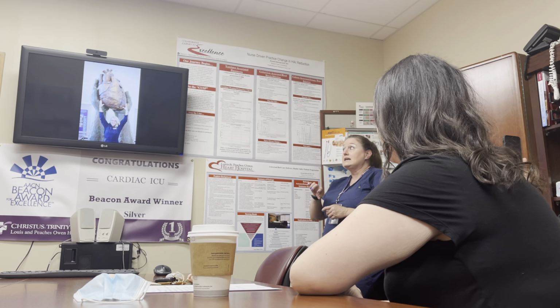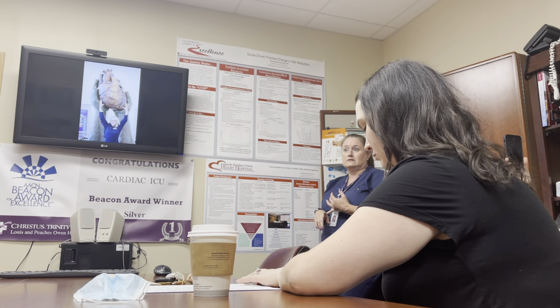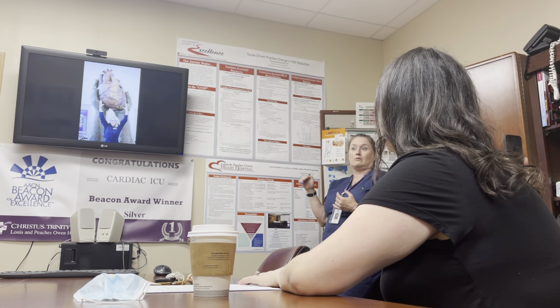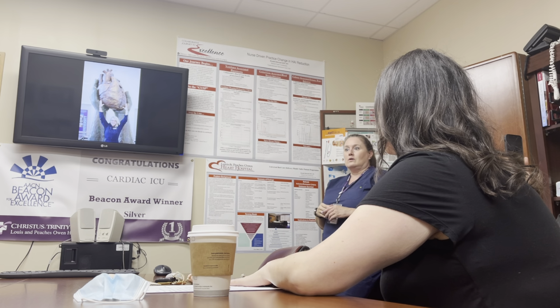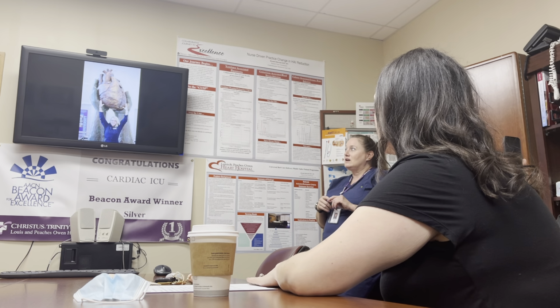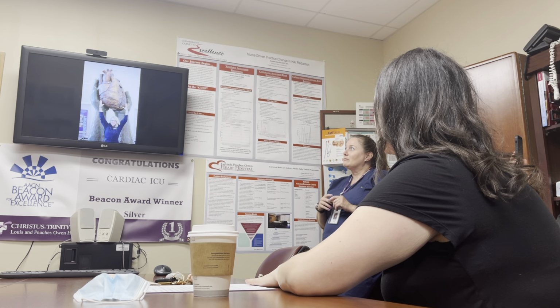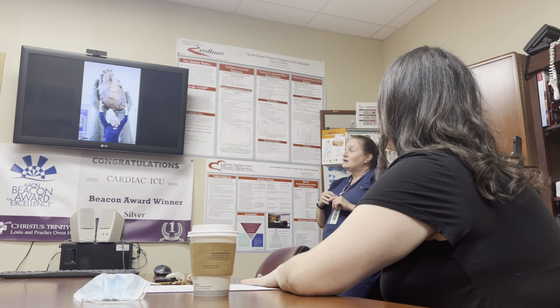Okay? And I geared this more to your understanding because you're going to see these devices. And I wanted you to be able to see what the devices look like on x-ray so that it's not completely a void. Okay? This was actually a picture taken from where I trained, my residency program. This was in the heart hospital. This is one of the flight nurses. So.